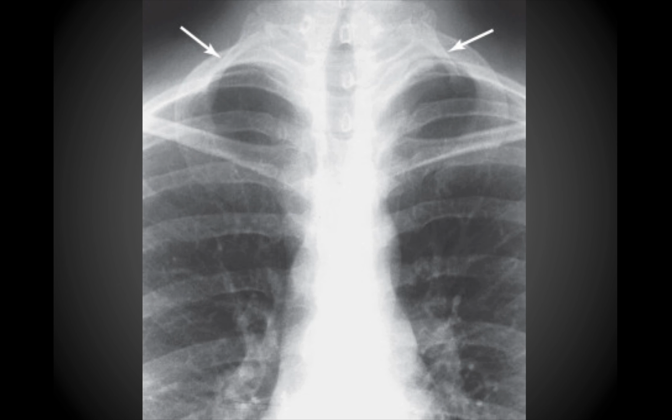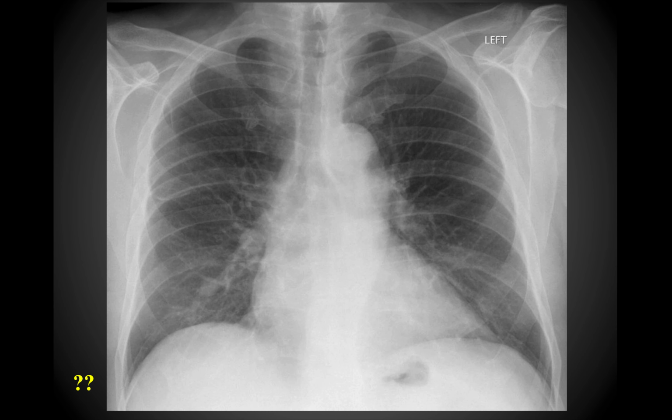And then in this individual, this is where you have a normal anatomical variant. So the arrows here represent cervical ribs. So you can see here's the first rib coming around, and you can see these additional, almost look like enlarged transverse processes on the C7 vertebra heading down inferior laterally. But in fact, this is a cervical rib bilaterally in this individual. And they are usually bilateral in most people.